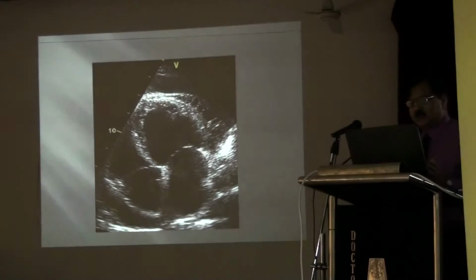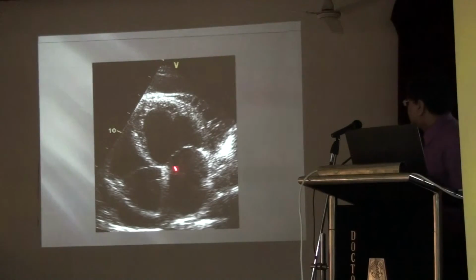Now there are some pictures. Day-to-day practice, every day we used to see. This is the picture where we see the wall motion hypokinesia. Okay, this is a still picture. But when you see the moving picture, wall hypokinesia is a basic thing.